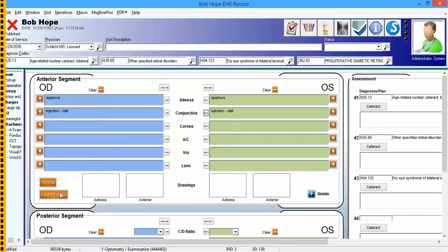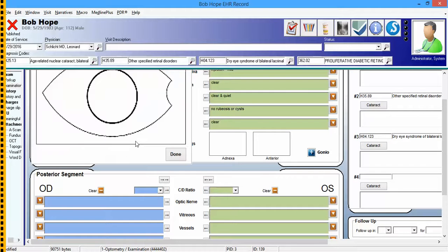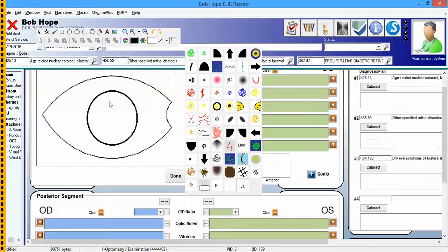Okay. These are drawings here. These can be accessed by just left clicking one time. When the drawing appears, left click one more time, then you're free to draw. My recommendation here is to just start a drawing, click on each of these buttons, just kind of see what they do. I'll demonstrate a few things.